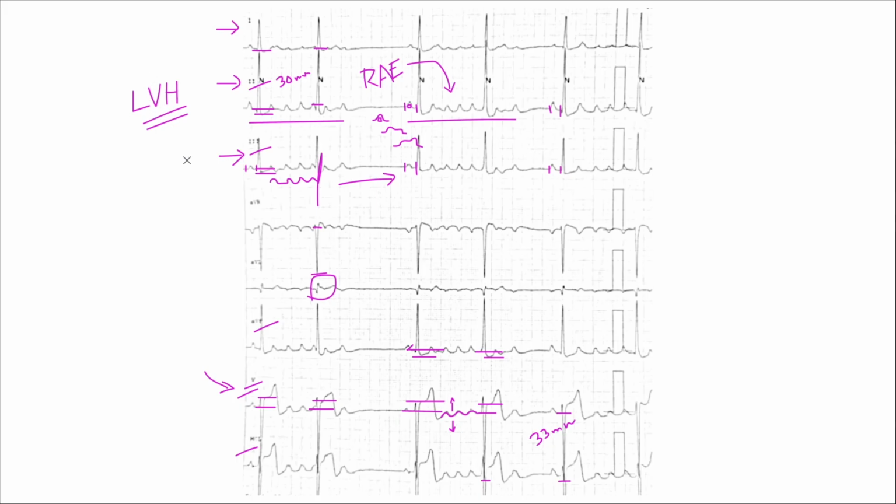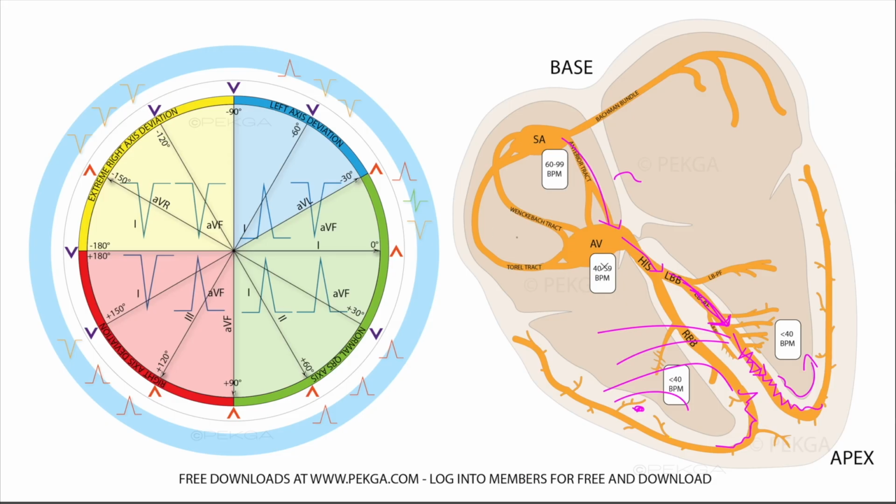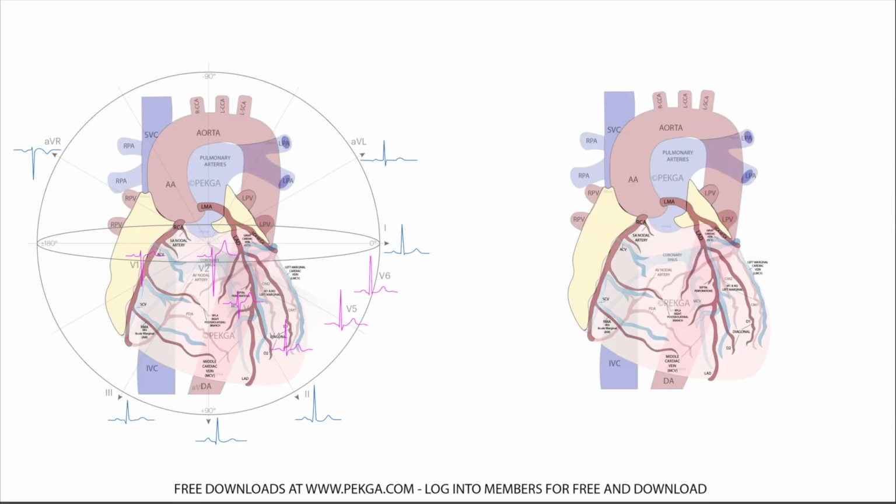This could also be septal. And the reason I say that is, let's see here. Do I have it here? Yeah. So if we take a look at this, actually, let me go to a different screen. Here. If we take a look at that, right? So here's your lead 2. Excuse me, no, that's V2. I want to take a look at lead 2.